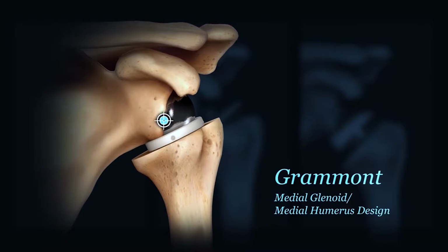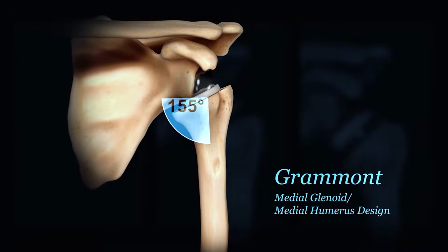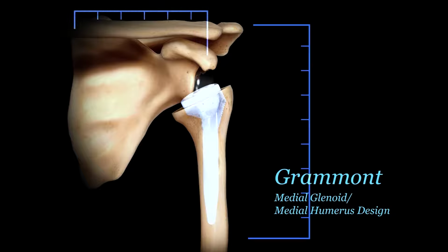The Grammont reverse shoulder glenosphere, whose thickness is 1/2 its diameter, medializes the center of rotation to the face of the glenoid to minimize the torque on the glenoid bone implant interface and increase the deltoid abductor moment arm lengths. The Grammont humeral prosthesis has a 155-degree humeral neck angle and is placed within the humerus, causing it to shift medially and be placed directly inferior to the glenosphere, which elongates the deltoid but shortens the rotator cuff.